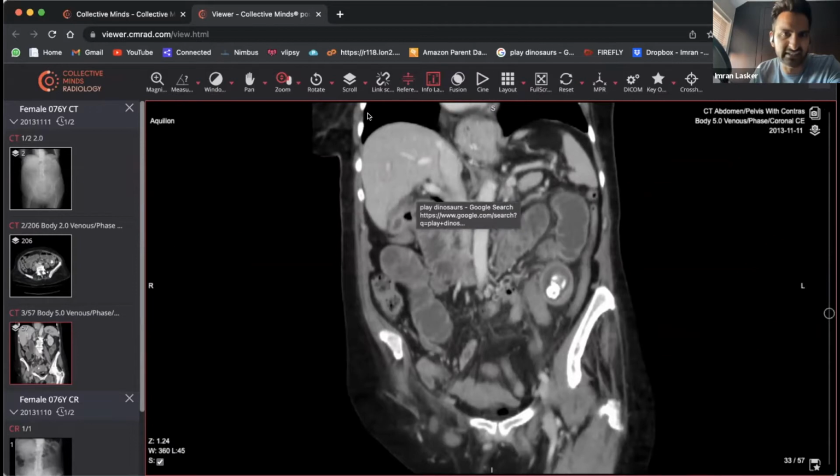So obviously, depending on the angle that the X-ray was taken, you've got this. So someone said it exactly right. Yeah, well done. And you've also spotted the height earlier. Well done. So yeah, this is exactly it. Someone has said what it is, and what it is, is a gallstone ileus. This is a gallstone ileus.